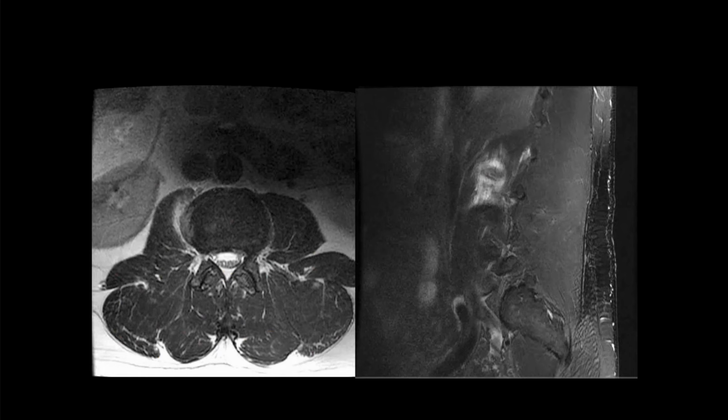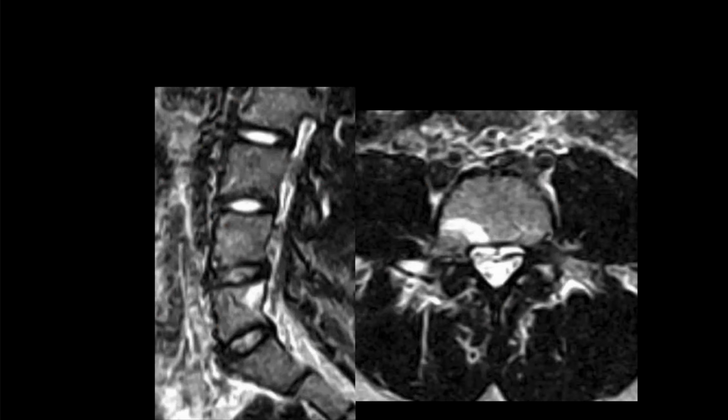Tayson, what do you think of this case? All right, so it looks like we have some edema there in the proximal right psoas muscle. Yeah, and then also in the bone here as well. Yeah, a little bit in the bone as well. And here are the sagittal images. This was a psoas strain, and this is probably a little avulsion, I guess, off of its attachment to the spine.